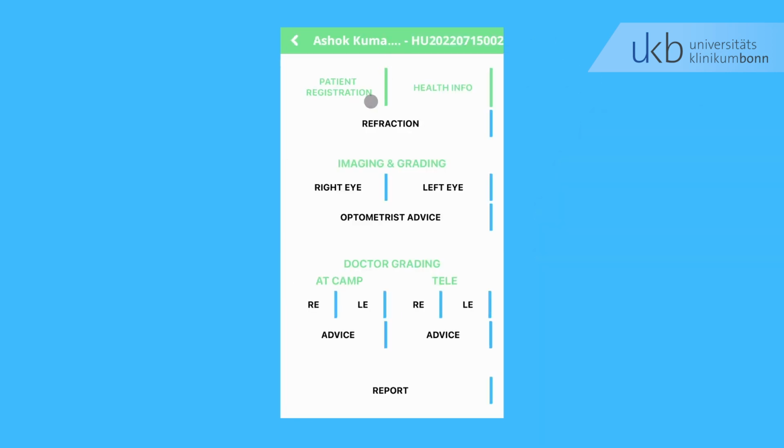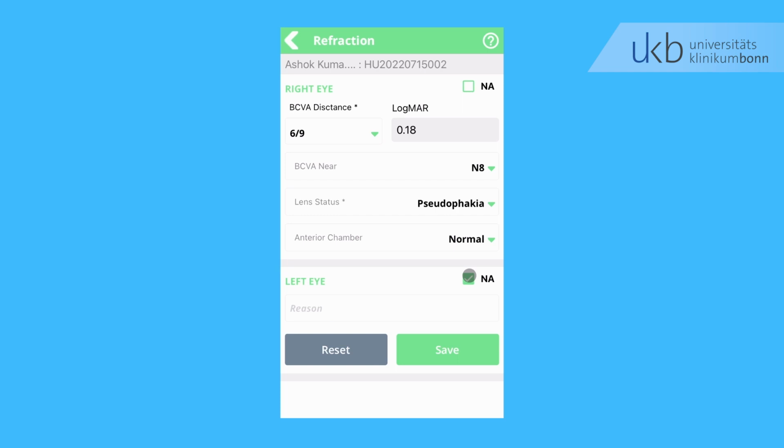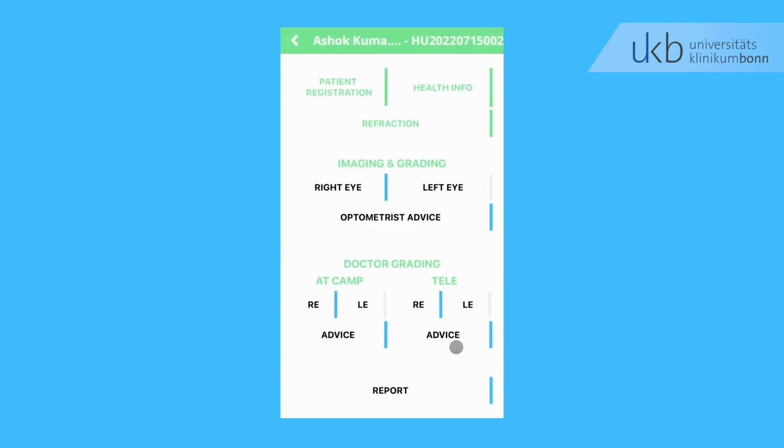The next step is refraction. Therefore, after you examine the patient, you enter the best corrected visual acuity for both distance and near for both eyes. You also enter the assessed lens status. Next, enter whether the anterior chamber is shallow or normal. If you cannot assess one of the eyes, select NA in the top right corner, which stands for Not Applicable. After each step, click Save in the lower right corner to make sure the data is secured.